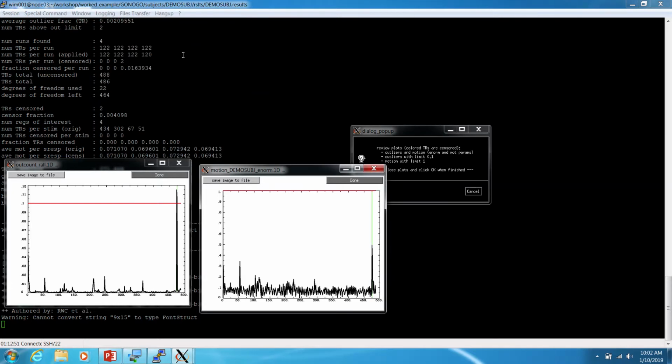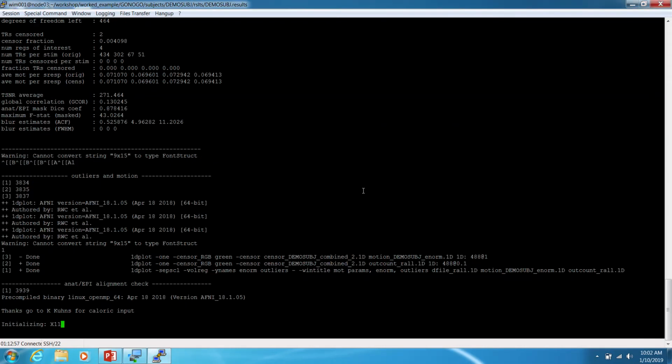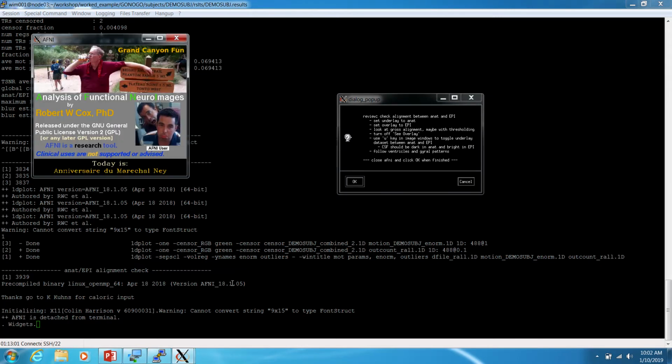So then you want to close them, and then we'll run you to the next step. All right. This is a very important step. So this is our review of alignment.